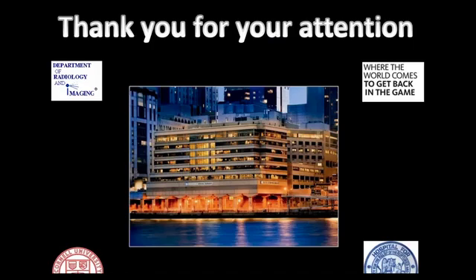In terms of medical legal implications, I think it's a real challenge to know, but they're considered both degenerative and traumatic. Next question, is it okay to describe mixed types of Modic? Yes, they can occur. You see type 1 and type 2, or type 2 and type 3 together. It gets a little tedious, so you may just want to go with the dominant one and say there's some end plate signal alteration. The dominant one is edema or fat, or mixed edema and fat. And again, that helps you up your ante that the disc is painful, particularly when they're sizable, like we talked about.